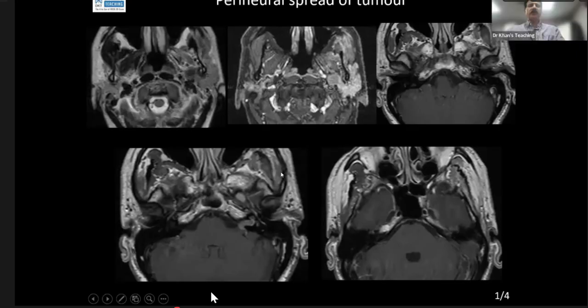This patient came to our hospital since 2 years with facial nerve paralysis on the left side. The imaging which was done was CT temporal bone. Many a times MR was done by the neurologist. But the key point which everybody forgot is that adequate imaging was not done of the parotid, because parotid lesions can also cause facial nerve paralysis.